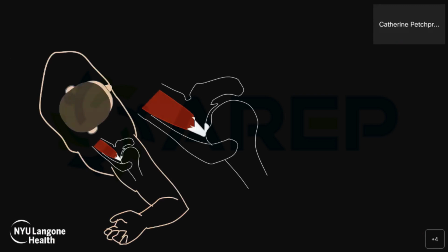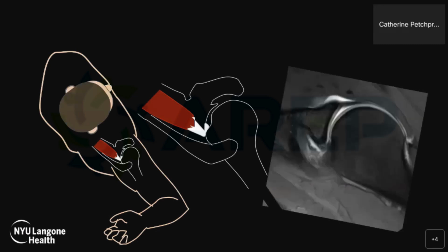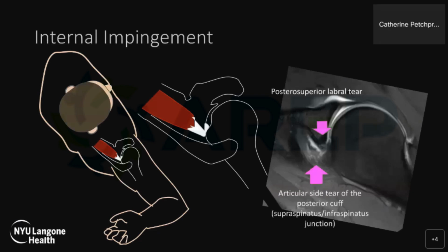Let's take a closer look at the late cocking phase. The shoulder is at maximum external rotation and abduction. In this position, the articular surface of the posterior rotator cuff and posterior superior labrum are impinged between the greater tuberosity and the glenoid rim. This causes tears of the posterior superior labrum and articular side tears of the posterior rotator cuff. It's called internal impingement. It's manifest clinically as posterior shoulder pain and stiffness, and it's in this impingement position that we do our ABER imaging.